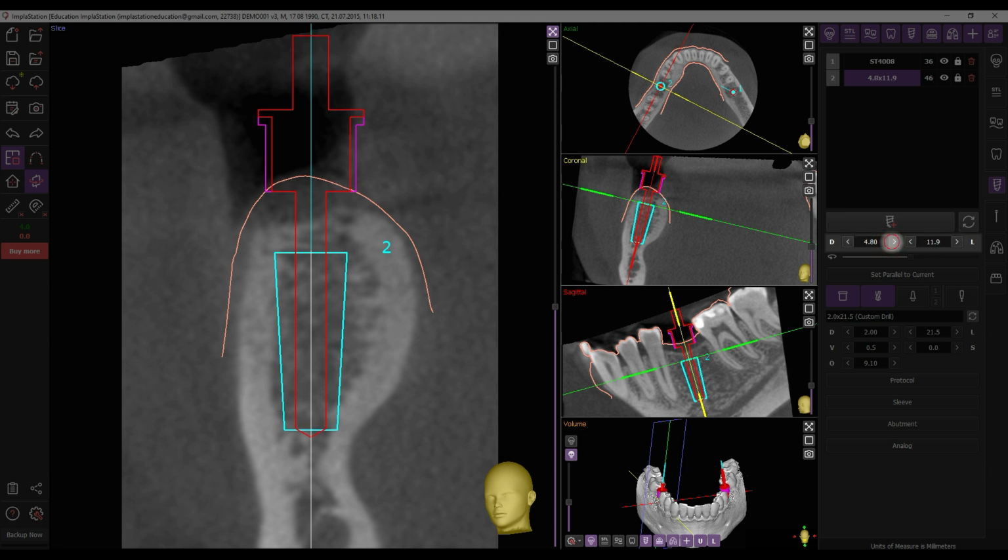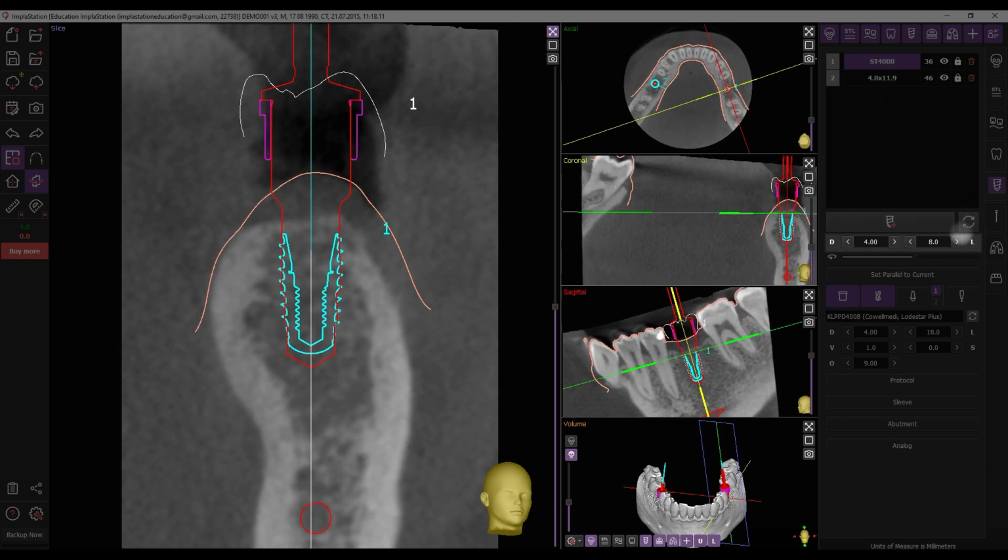Custom implant size changes will occur in increments of 1/10 millimeters. Library implant automatically switches to the next implant in the library list. After modification, the program will automatically suggest the corresponding drilling protocol, master drill, and guide sleeve considering the updated parameters.